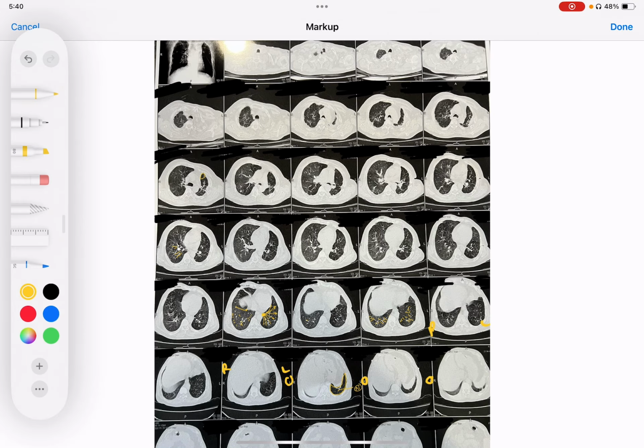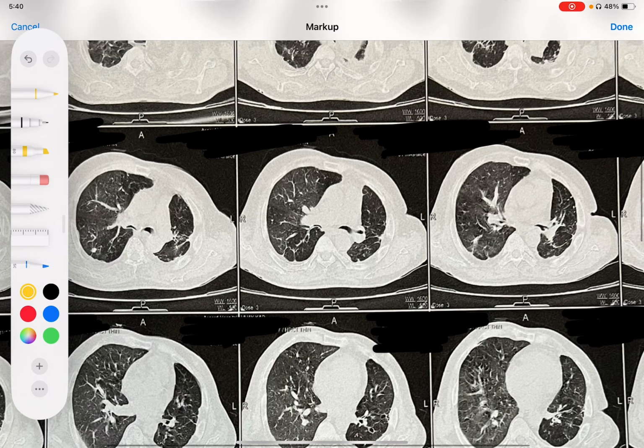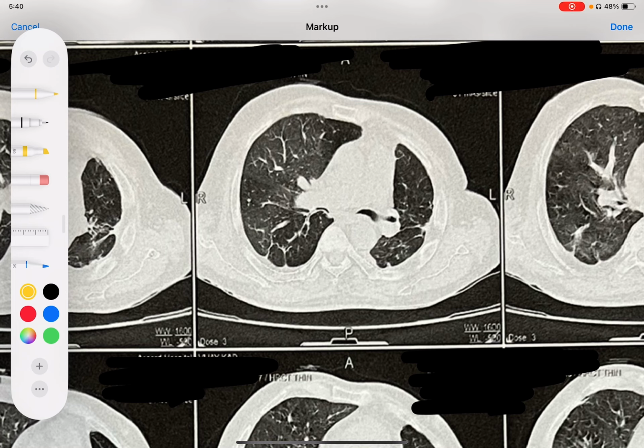Coming to other findings, because there are so many good findings: ideally both the left lung and right lung should have approximately the same size or volume. But if you can see here, as we know, this is the left lung and this is the right lung, because it is written right and it is written left. Just compare, this lung appears so much smaller and this lung appears so much larger. This lung looks almost 2.5 times the left lung. So what is the problem, or where is the problem?